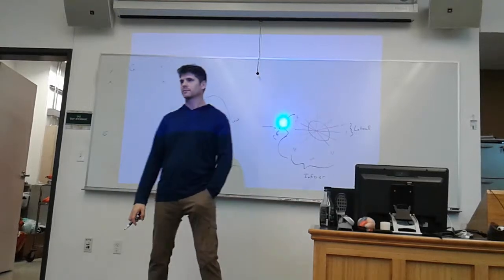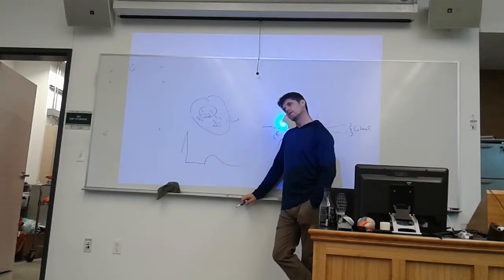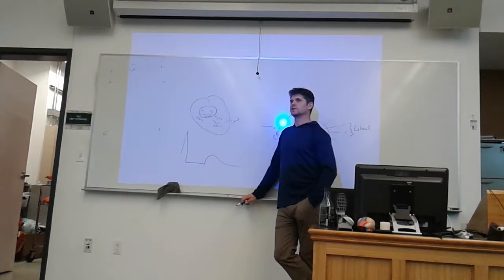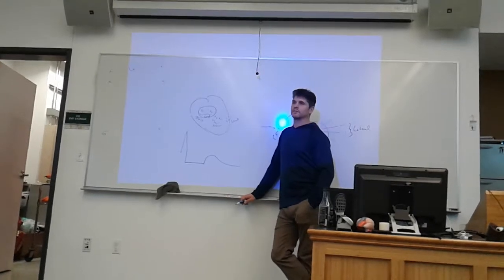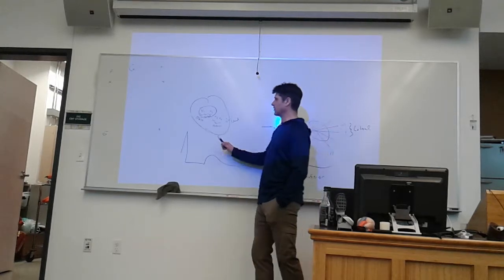They've just decided it's not worth having 3 more V leads you could just plug in. There's a lot of expense in adding 3 more wires to the mix and making software algorithm changes to recognize that. And there's not a reason for it, because we can just do it this way when we see a posterior MI. Posterior MIs aren't as common as, say, anterior MIs or lateral MIs. So those are the ones that are most important. And 7, 8, 9 are a little inconvenient to get to, because you have to keep your patient propped up to get them. But that's what you'd be looking for.